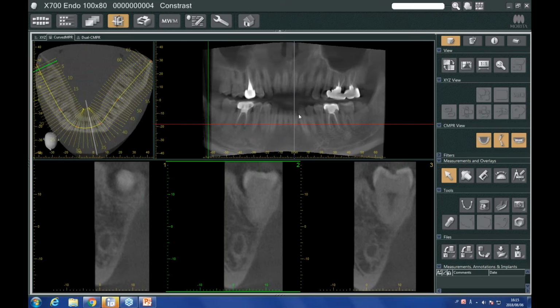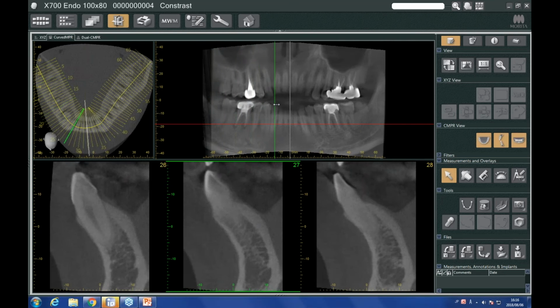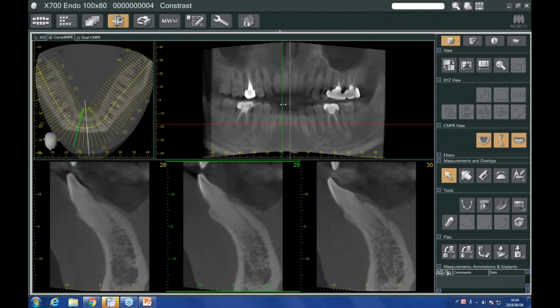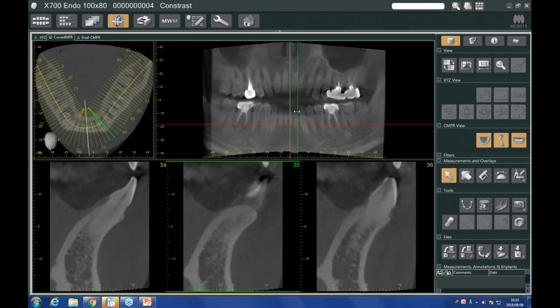This line that's down the center, this is marking the patient's mid-sagittal. So basically, I want to set this to the center of the actual patient's mid-sagittal, which is about here. And what this is going to do for my cross sections is it's going to flip the cross section orientation once I go to the opposite side of the mid-sagittal. This is again just for orientation purposes.